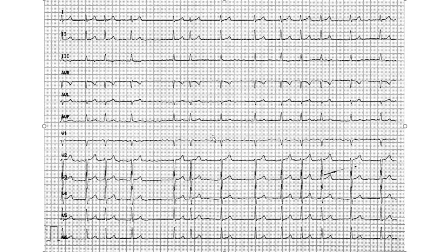So the frequency, if you say 3, 1500 divided by 3 is 500. So a frequency of 500, atrial fibrillation. Okay, so you don't calculate PQ. That done? Next question. Of course, you don't stop there in the credit test.